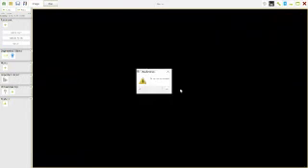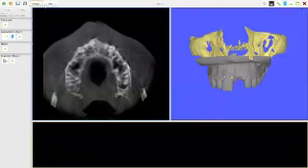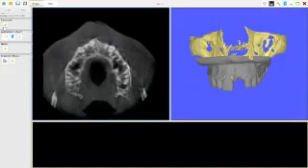Another way of doing that is I could just position it. Oh, don't quite know what's happened there. Right, I'll just go quickly back to the plan. I'll just quickly do the curve again.